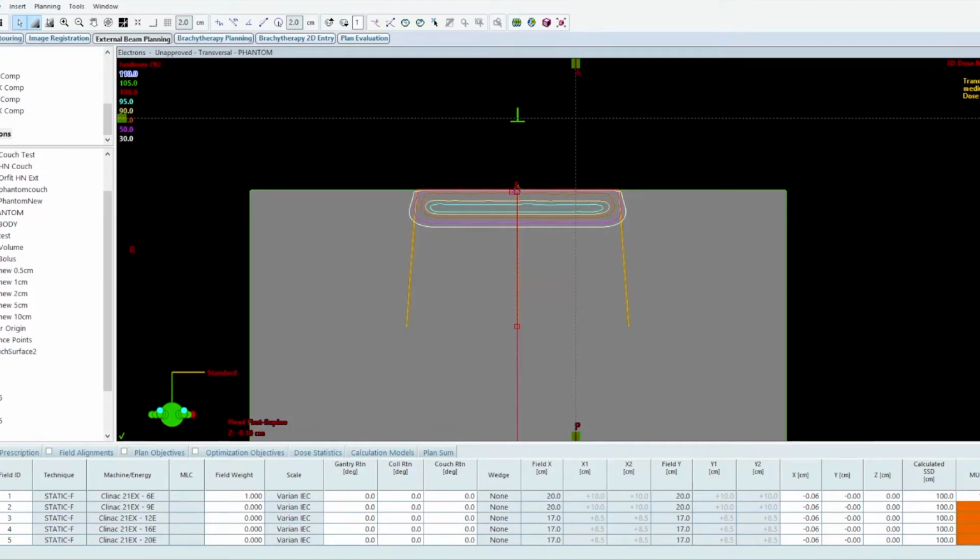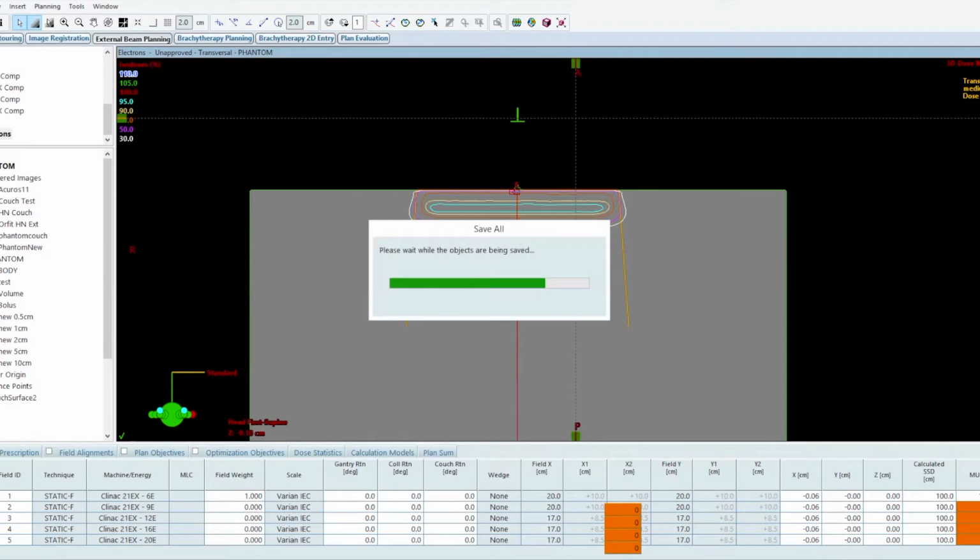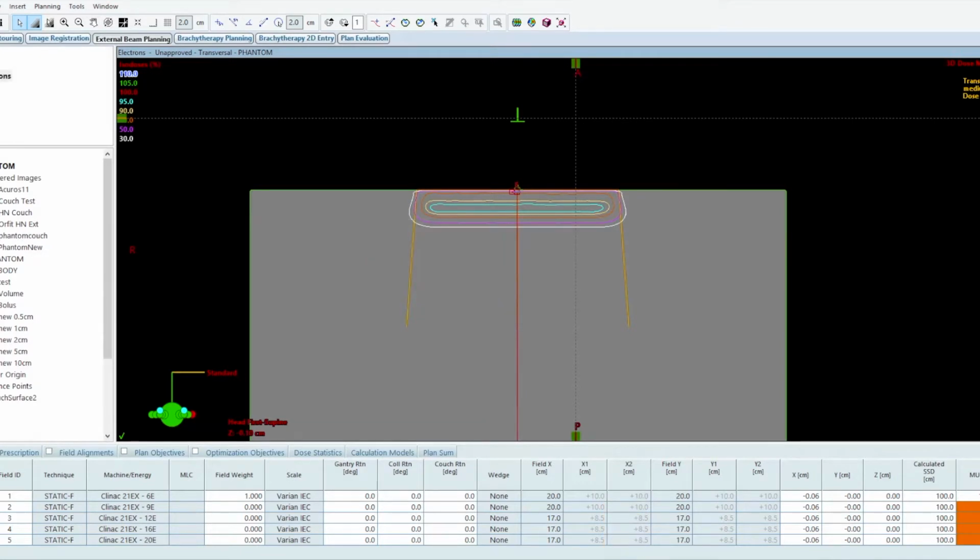This lecture is going to focus on electron treatments, percent depth doses, and isodose lines. What I have here is just a flat water phantom. The entire phantom is just filled with the density overridden to water. I have 5 different electron beams.